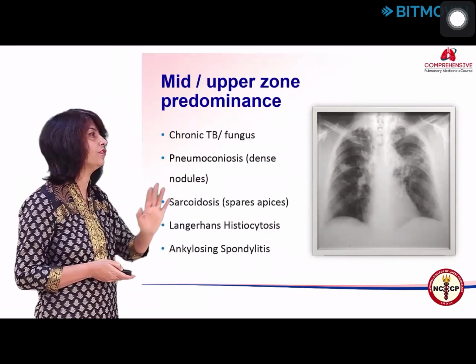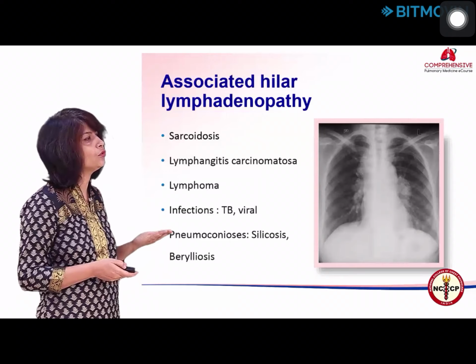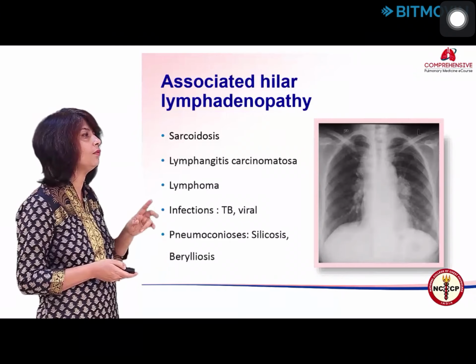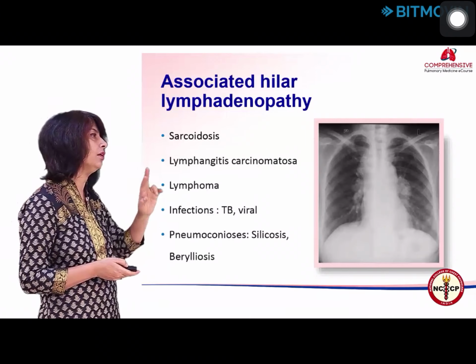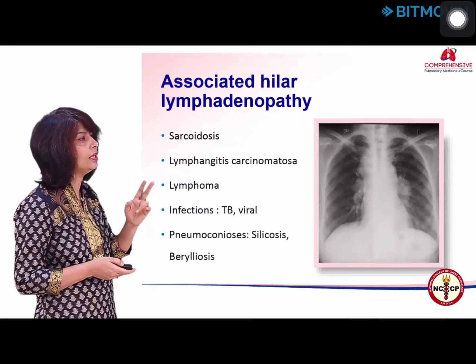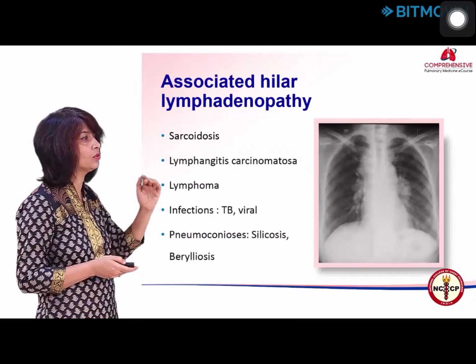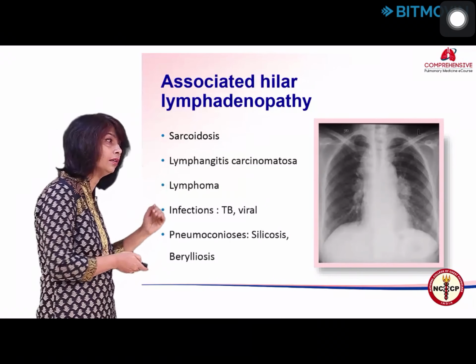But these are the two differentials for a radiograph like this. Then, as I said, if you see associated adenopathy, we saw a similar case in part 1: right paratracheal nodes, hilar nodes, and what I really like, I showed you at that time also what I called infrahilar, and after the infrahilar, the bronchopulmonary.